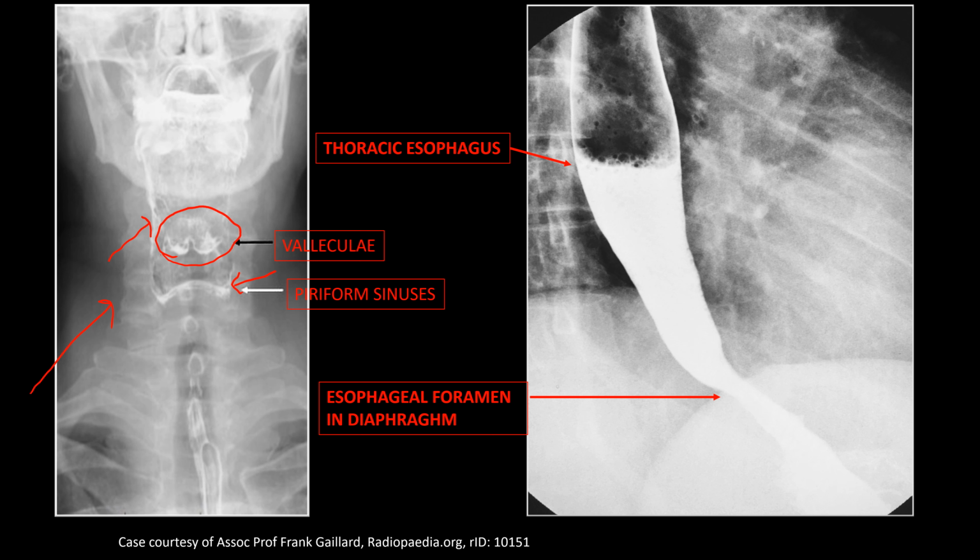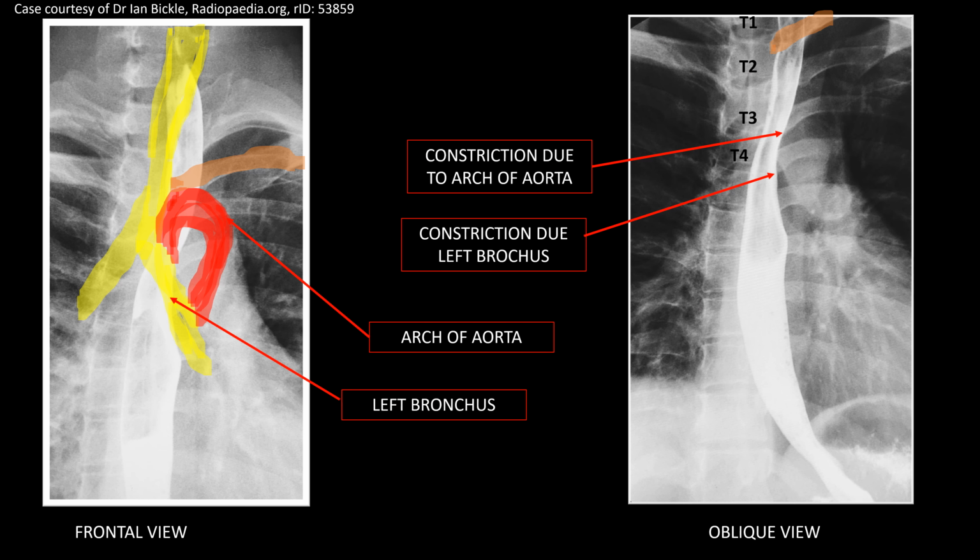Second image shows the esophagus in the thoracic part. This is the outlining of esophagus. Because of the barium, we can see a radio opaque shadow. Esophagus passes through the diaphragm at this level and it enters in the abdominal area. In this image, we can identify esophageal sphincters.